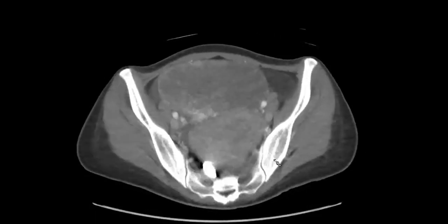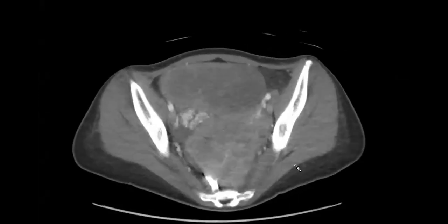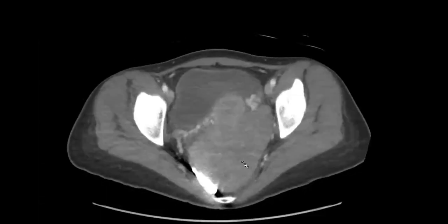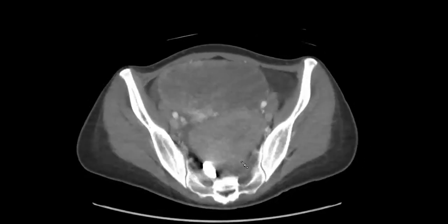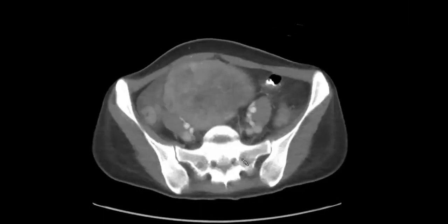Oh, I mean, they're almost like giant fibro, like solid, small mass neoplasm. So fibromas. Yep. So giant bilateral adnexal masses. Fibromas is one thought. Anything else? So you can think about, yes.